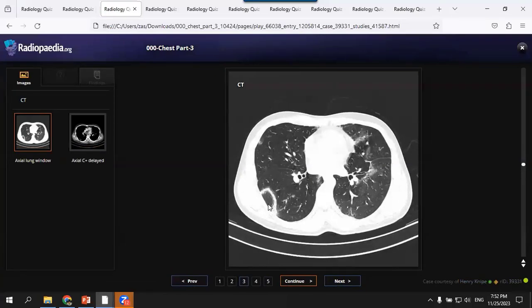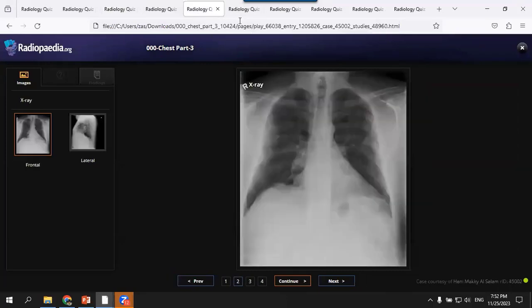If reversed halo, think of COOP, eosinophilic pneumonia or bronchoalveolar carcinoma. From X-ray, you may be deceived and say it's peripheral patchy opacities, reversed batwing, but you may encounter calcified plaques. So remember, asbestosis may give this pattern.